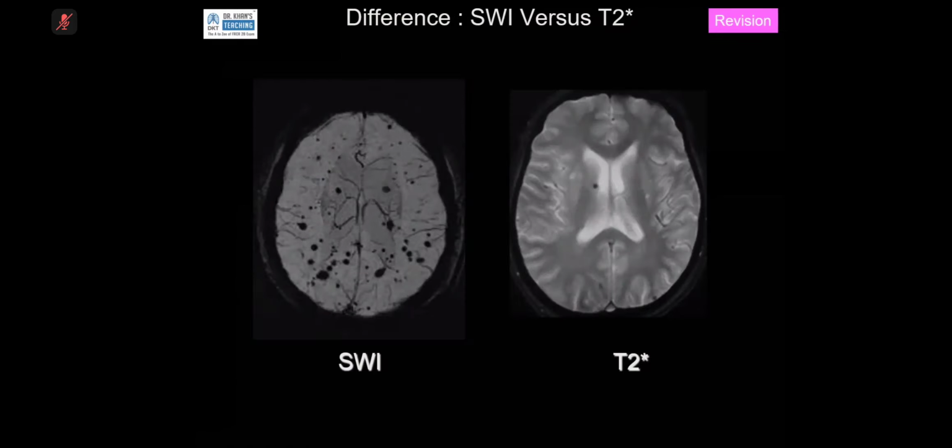Please remember that there are two susceptibility weighted image sequences, which all depends on which department you are working in. There's a T2 star which is gradient echo, and this is an SWI, susceptibility weighted image, in Siemens terms. And one key point to remember is that the leptomeningeal vessels appear low signal. Don't overcall these as anything.